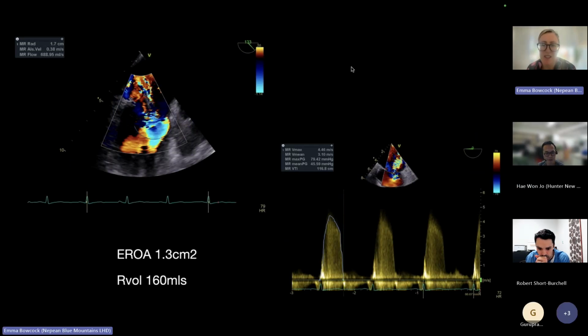Critique this. Yeah. So again, I'd be cautious about doing these measurements and relying on them in the case of endocarditis-associated regurgitation because of the irregular valve orifice. But that aside, from a technical perspective, to measure PISA radius accurately, you'd like to see the PISA dome, the vena contracta and the regurgitant jet all in the same frame, but that's not the case here.